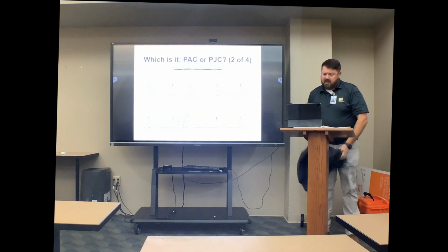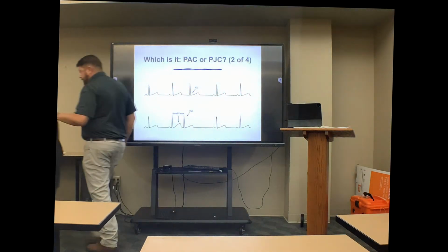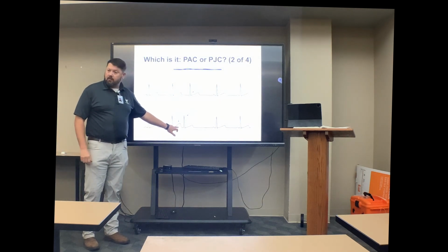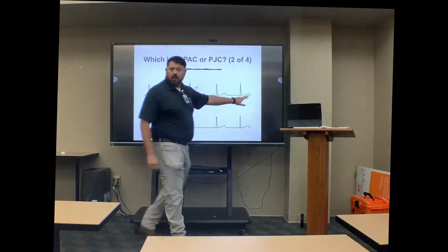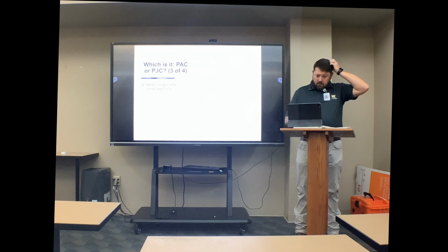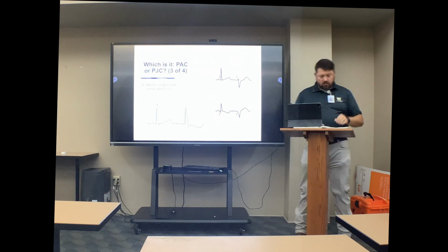Now, one thing I can do here is remember when you have that convergence of a P wave and a T wave, and you get that little bit bigger T wave right here. So that's one idea there, because remember, when we look at PJCs, all the T waves look the same, right? Also, look at your QRS as well.